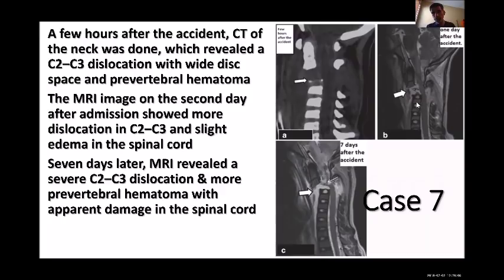Look at here, which is the space between the vertebrae. Look at the color, and look at the color here. What do you see? Like white color. Yeah, whiter, and you can see here. So this is the hematoma, and this is the swelling. Hematoma here, because it's a fluid. So hematoma will be a dark color in the MRI, like an abscess, because it's less dense.